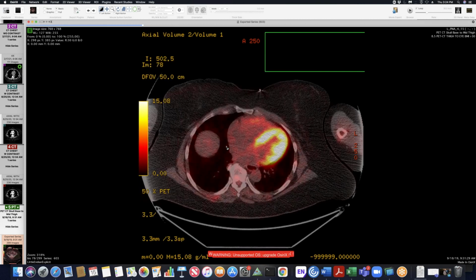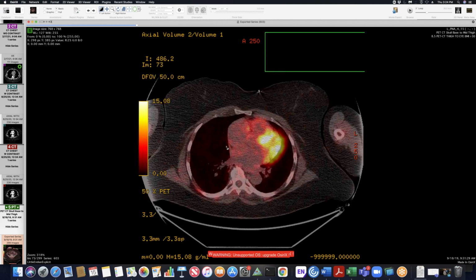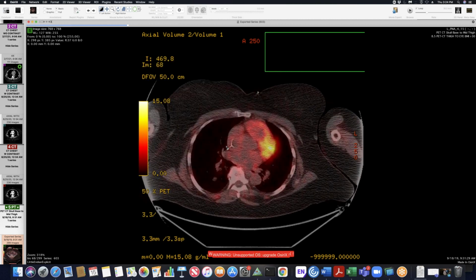So I looked at the patient's medications. He is on Miralax for constipation, so he could be on some other mineral oils for constipation. And then he also is on fluticasone nasal spray for asthma, which has been reported multiple times to cause exogenous lipoid pneumonia. That's Flonase. I think this is a case of lipoid pneumonia rather than metastatic disease. And furthermore, there was a PET CT, which gives more evidence here. There's no FDG uptake at all.